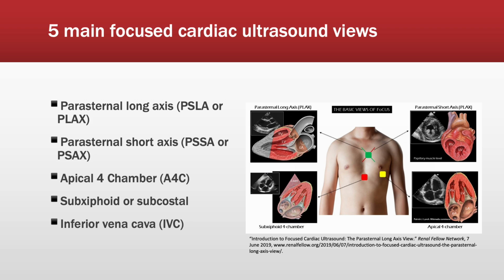Also, I added here one of my favorite cardiac point of care ultrasound schematics from the Renal Fellow Network, which I love because it shows you the probe position and the corresponding image that you're going to get while placing the probe in that particular area of the chest.